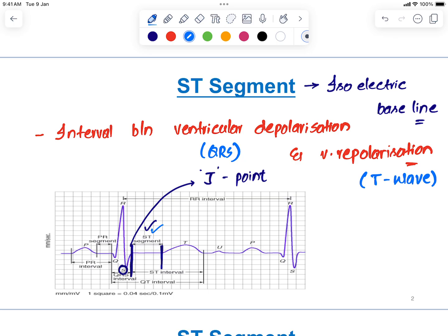Now, whenever you come across this particular terminology ST segment, the first thing that comes into your mind is the ST segment elevation that might be contributing to the development of MI. Now, you need to be very much aware of what should be the minimum ST segment elevation in the ECG leads to consider it as the myocardial infarction. You see a question here.